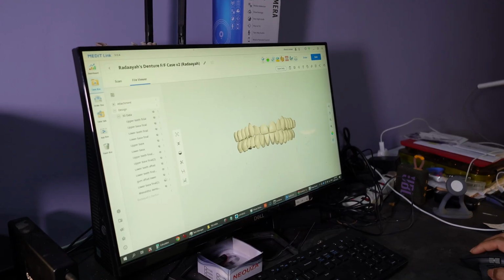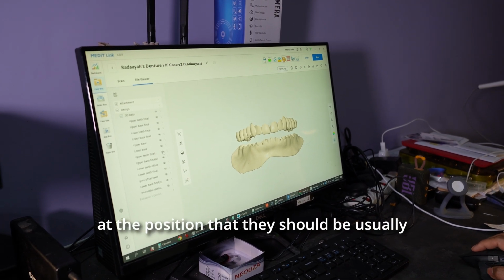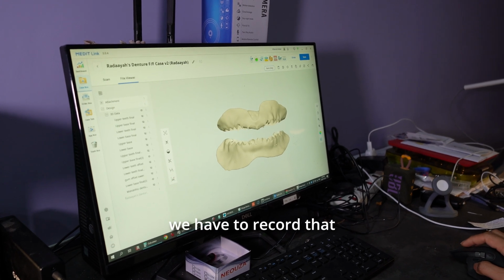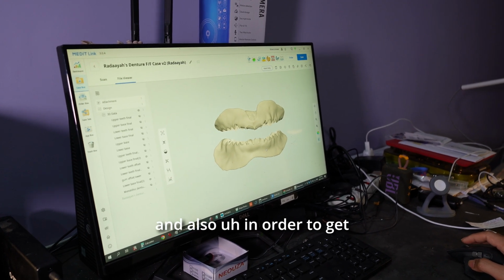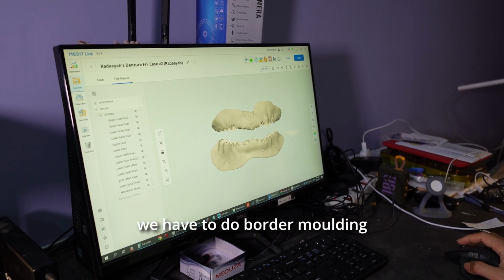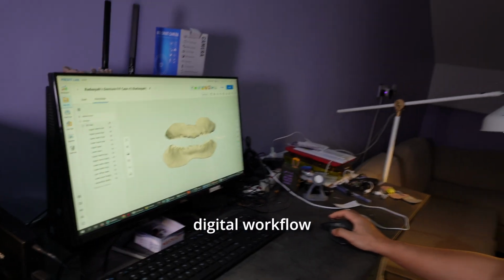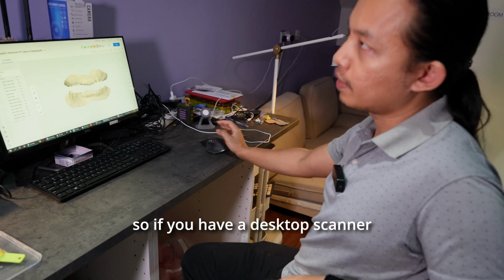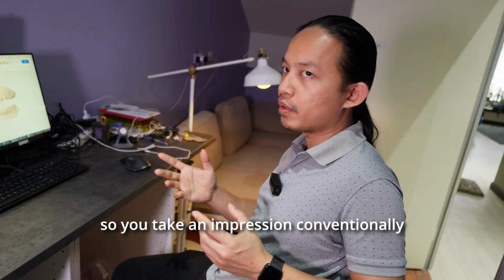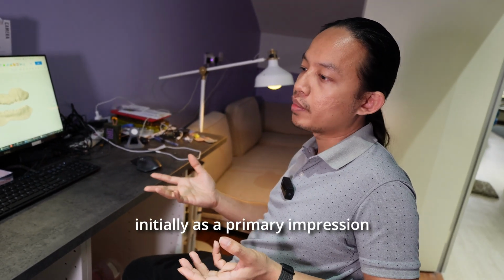In order to set the teeth at the position that they should be, usually we need to record the maxillomandibular relationship, and also in order to get a nice border of the denture, we have to do border molding. Then how different is this digital workflow? If you have a desktop scanner, you will still need to take an impression. So you take an impression conventionally, you use alginate initially as a primary impression.